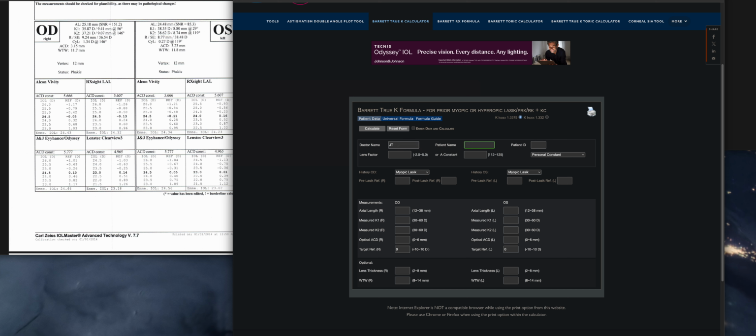I'm just going to do this for RK, 24 RK. All right, so this is where things get different. We're going to use an LAL for RKs, or usually for any refractive surgery. So remember, LAL is a monofocal 0.1. Now this is just a mnemonic, isn't it? It's not always that way for monofocals. And then here's a drop down, and you're going to select radial keratotomy, RK.